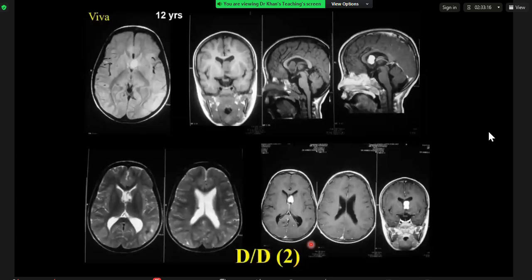contrast images. I'm just looking at this last coronal sequence, and the area looks very busy in the region of the cochlea and internal acoustic meatus. So I was wondering whether we are dealing with some endolymphatic lesions as well or not. Although thinner slices would help to have a look at them quite closely.